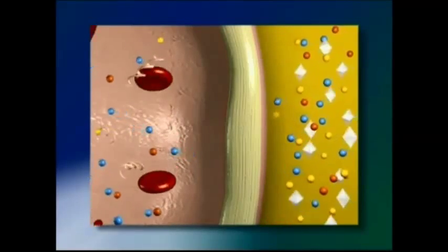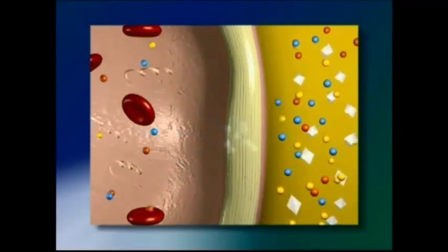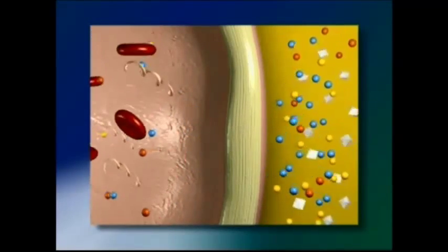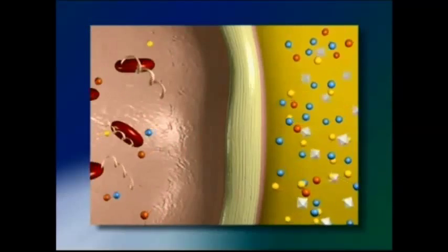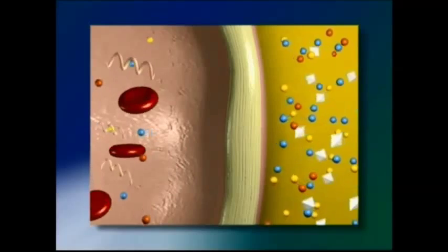During this time, excess water and waste pass from the blood into the dialysis fluid. The used fluid, containing the water and waste that the kidneys would normally have passed into the urine, is then drained from the body and replaced via the PD catheter.